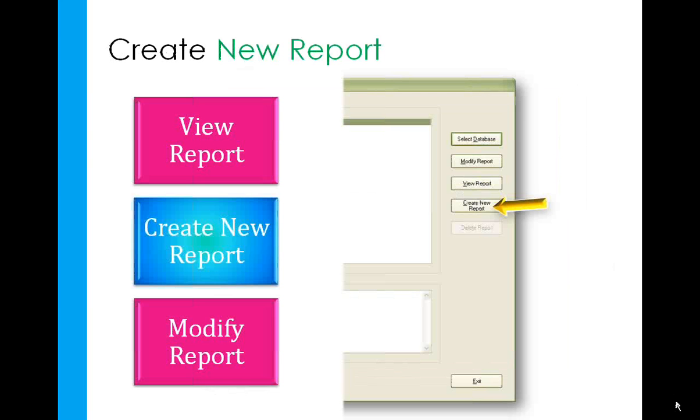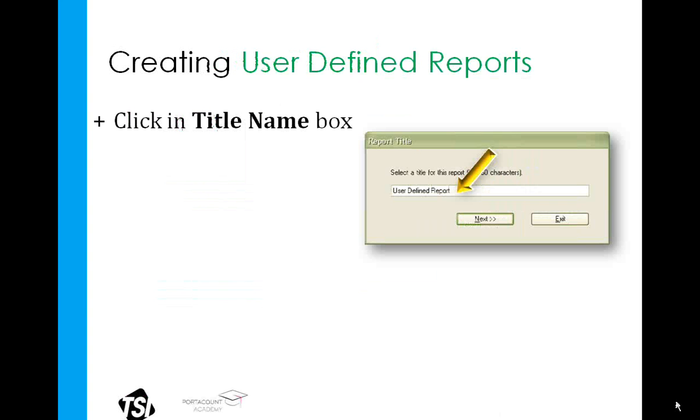Next, we'll move on to a user-defined report. And the examples I use in this class obviously do not represent the vast array of different report creating options. I would tell everyone again, feel free to play around with this create function. Keep in mind, affecting these reports does not affect the data, so there's no real repercussions here for making a mistake. It can all be undone. So at this point, click on Create New Report.